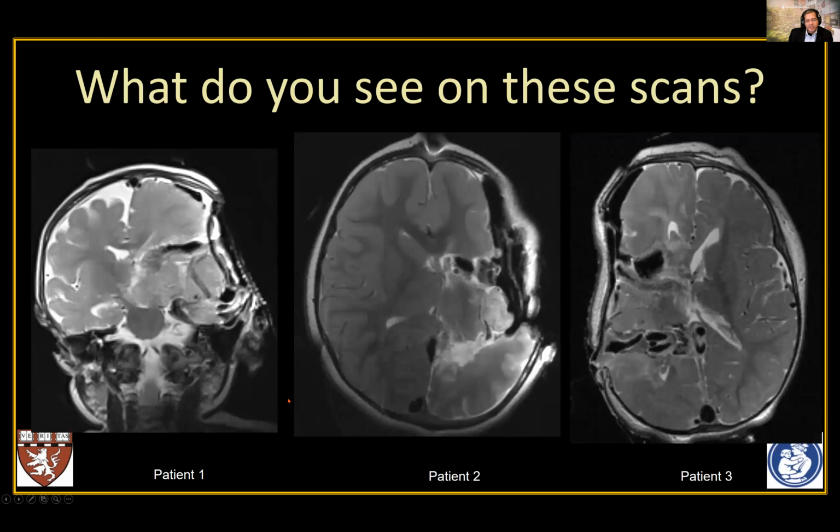To go back to the original scans here on these 3 patients, you've noticed the first patient here, the genu is still connected here, and so on this one as well. And this is another hemispherotomy patient here. And the third patient, this area was abnormal, but it was abnormal on the pre-op imaging. So this is not a complication. This is how the brain looked before the procedure.